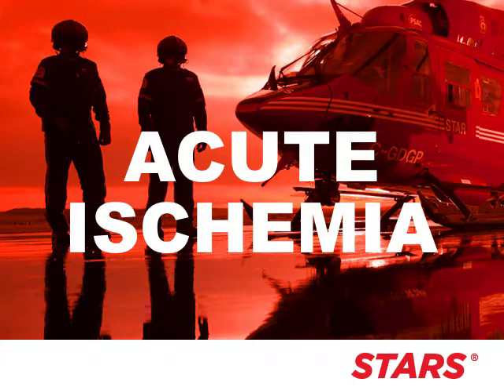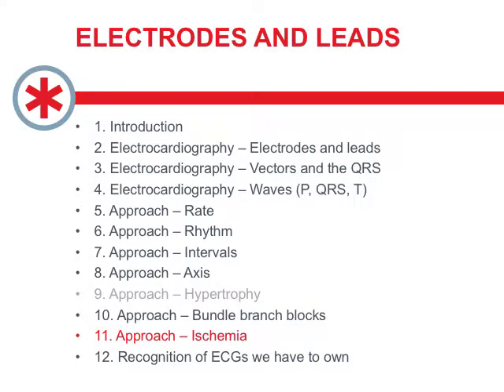Well, hello everyone, and welcome back to the next lesson on our ECG interpretation. And as you might guess, we are going to be doing the EKG signs of acute ischemia. So in this lesson, we are really going to talk about the classic changes that we see in ischemia. There are some really specific cases that we're going to deal with when we talk about the ECGs we have to own. But this is just a refresher on some of the classic findings. And then we're going to talk about localization. So how do we use the ECG to actually localize these ischemic findings on the heart?